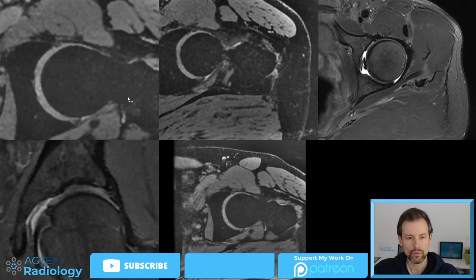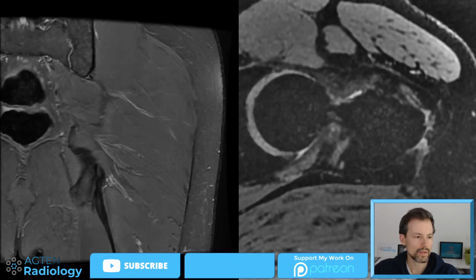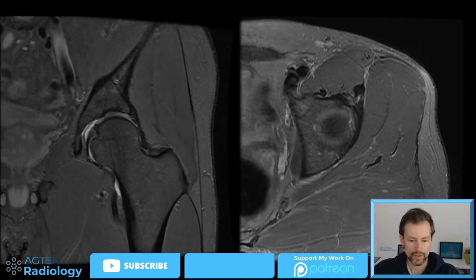And we can now try to find out the exact length of this finding. Let's see, how do we do this? We need this one and not this one, maybe this one. Okay, so where do we see it first?